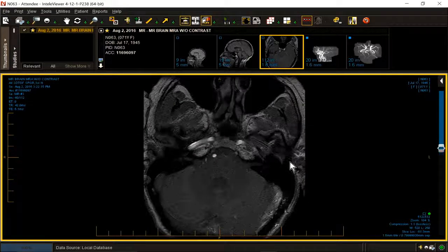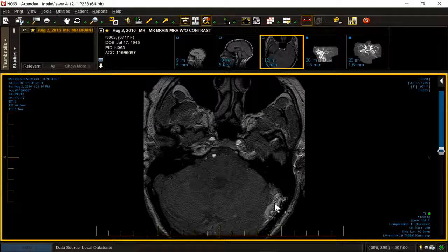So our diagnosis is a vascular abnormality, this one in its most characteristic location along with the carotid cavernous area, and this is known as a dural AVF, a dural AV fistula, which some might consider a subset of an arterial venous malformation. But it is not parenchymal, and it is related to the dural venous sinuses.